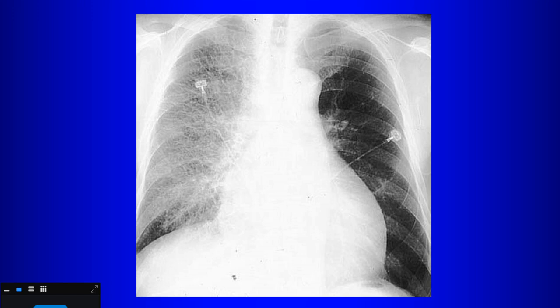Well, if there's a big PE in the left pulmonary artery, that actually protects that lung from pulmonary edema. So contralateral pulmonary embolism can be a cause of unilateral pulmonary edema. On the other hand, if I told you that this patient had a procedure done for pulmonary embolism, what procedure was done and what side was it done?